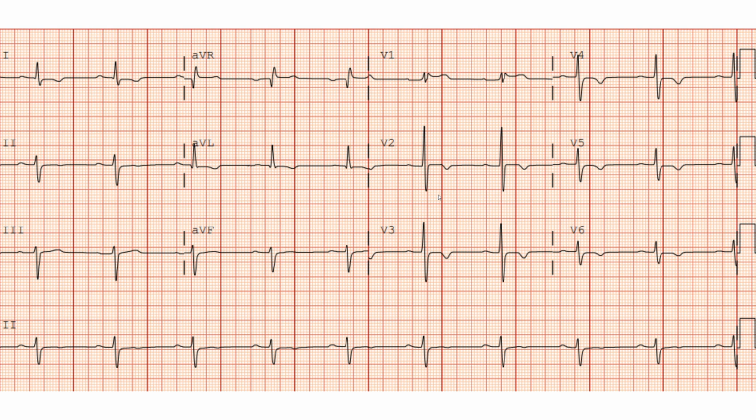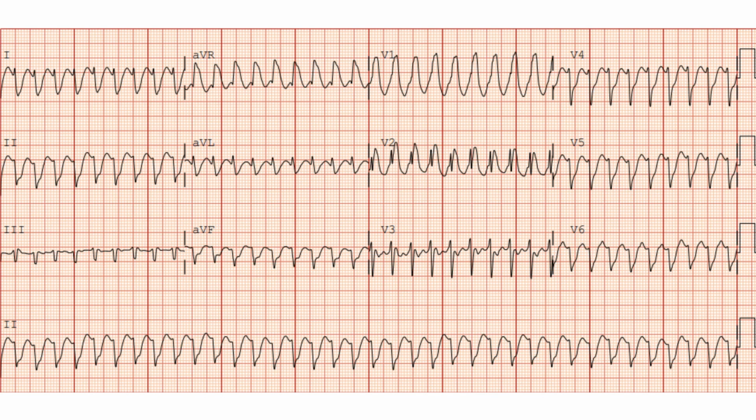So this is what this guy's EKG looks like all the time. Remember, he came in for palpitations and chest pain. So this is the EKG that Biba and I saw on arrival. Same thing, pause your computer, take a couple minutes, write down what you think, and then compare it to what I say. Now, the whole thing for this case in this EKG is how do you determine what's VTach and how do you determine, well, what's SVT with aberrancy, right?